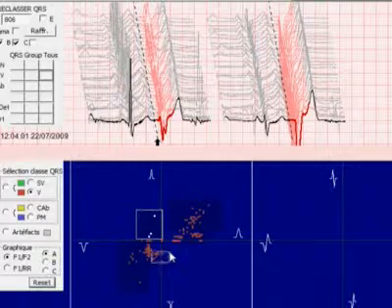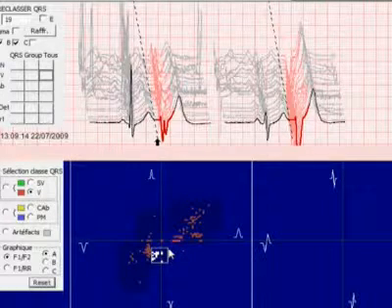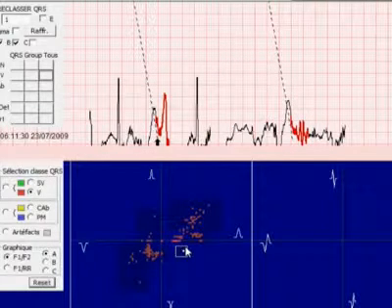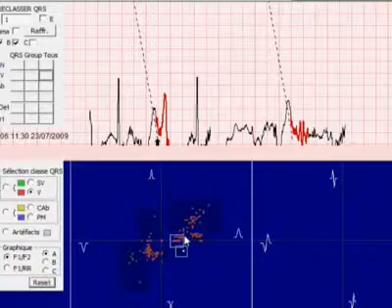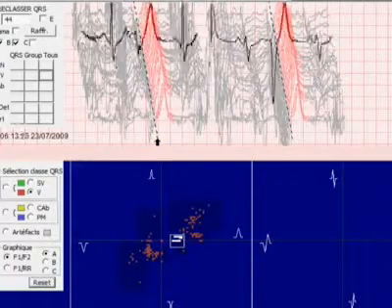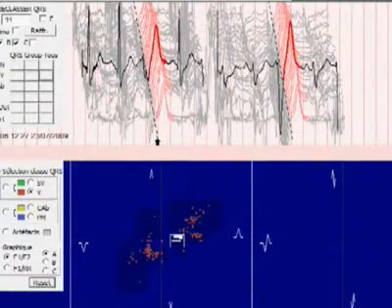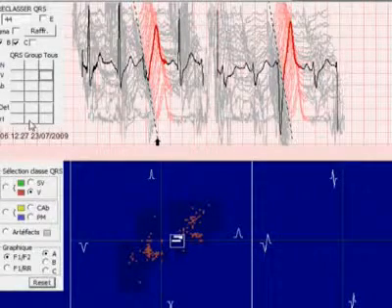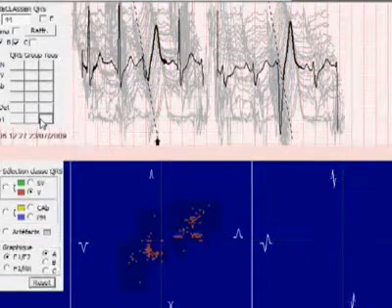It is possible to erase the lighter zones by clicking on the Reset button on the left. Examination of the central area, corresponding to low width and height, shows an overdetection of the T wave. All of this signal can be eliminated by clicking on the button Column All and Line Artifact or Overdetection.